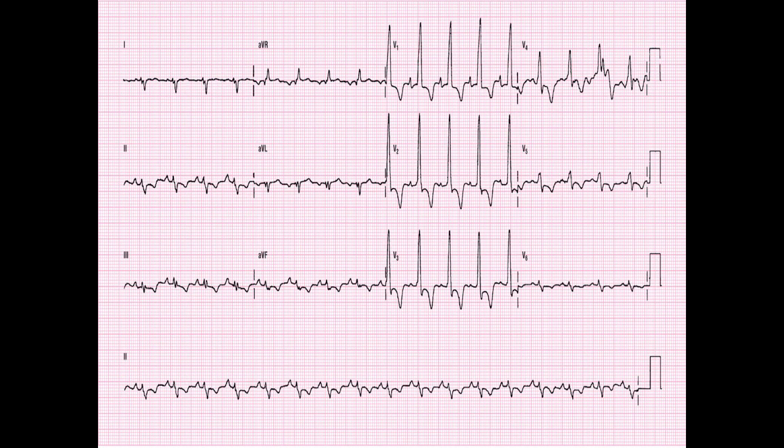On this EKG, we're seeing ischemia again, right? So ST segment depression into an inverted T wave. Here, this ischemia is because it's a ventricular strain pattern, right? But ischemia nonetheless, so we're still going to call it ischemia on your assignments. You say, where do you see ischemia? You say, well, I see ST segment depression in these leads. That's what we're going to be looking for.